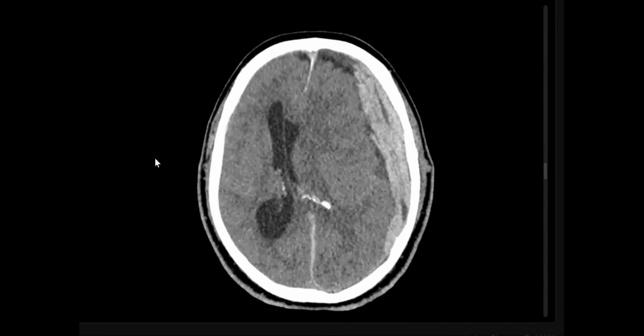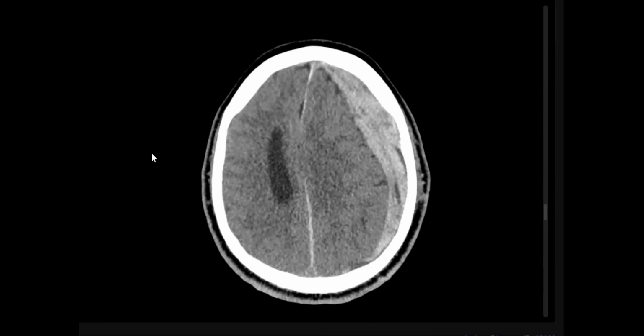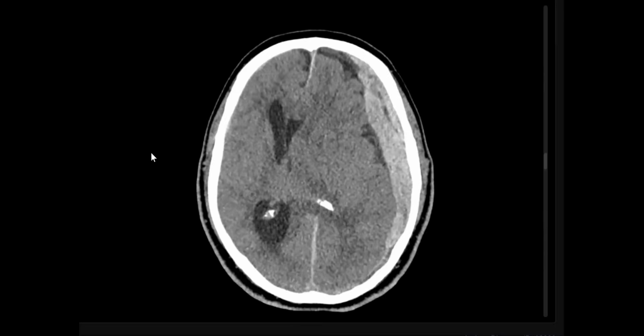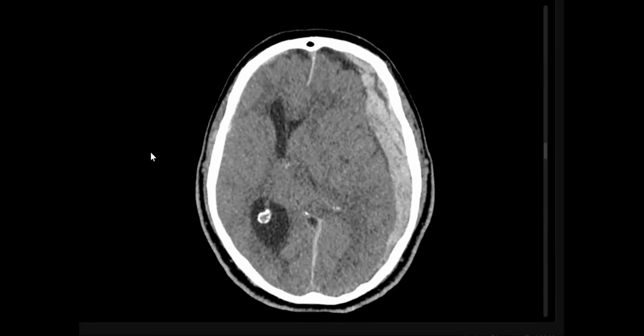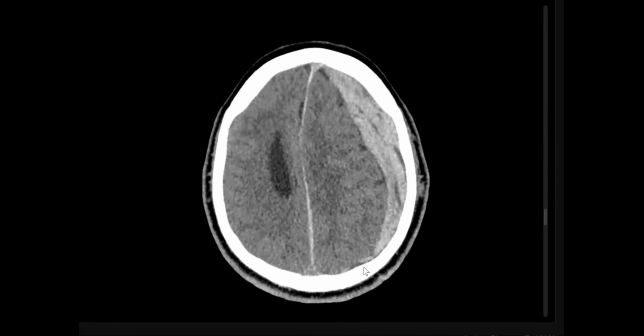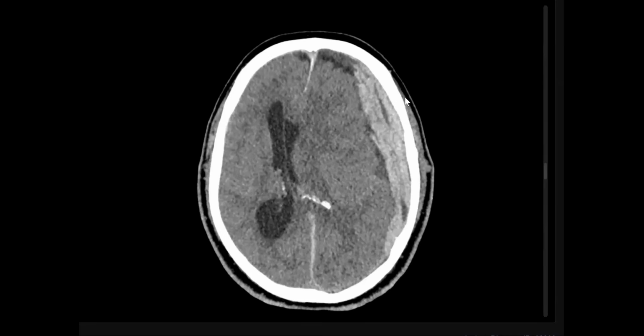Now, why did you choose subdural, not epidural? Because first of all, it is not limited by the suture. It is limited by the dural reflection in the midline, extending into the midline. Excellent. So it's acute with an added hyperacute element. So the patient is actively bleeding. With the swirl sign, the hypodensity is hyperacute blood.